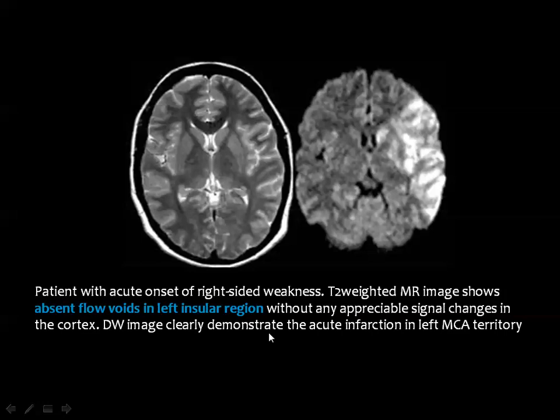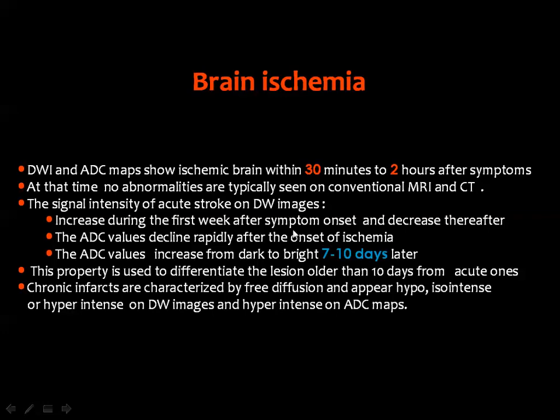And look here, if you look carefully at this image, you see in the right insula some signal void vessels, which are the branches of the middle cerebral artery. If you look carefully here, you don't see such branches on the left side, and this is not enough for the diagnosis of ischemia. But in the diffusion weighted image, you can see that there is a big area of diffusion restriction, which represents the hyperacute infarction. And diffusion weighted images and the ADC map will show the ischemic brain tissue within about 30 minutes up to 2 hours after the symptoms.